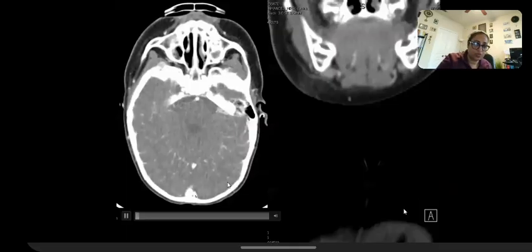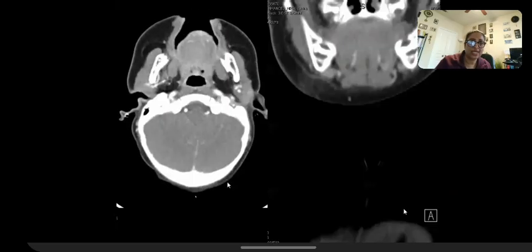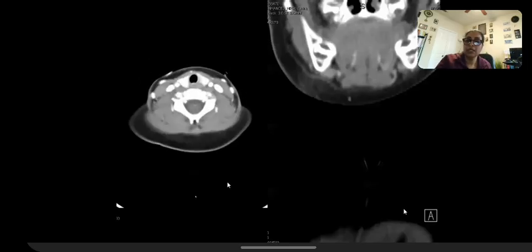So let me see if this will work. Yeah. So here's showing you the abscess on the video, because sometimes it's very difficult to show it on static images. So follow that thing. You see how it came from the EAC going through the parotid gland and dumping into the submandibular region.